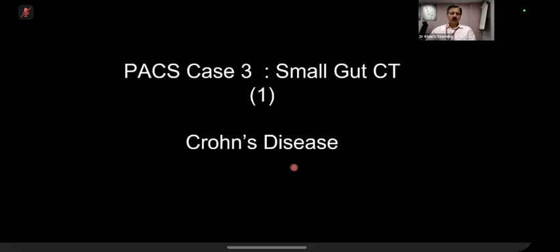Okay, I am going to show you a CT scan, and this is a brilliant film because so many films now come in the exam where, once you know the same pathologies that you can see on a barium, you can see them on a CT scan and things like that.